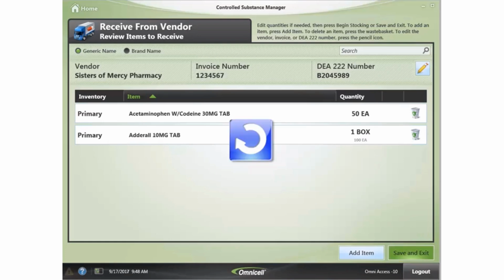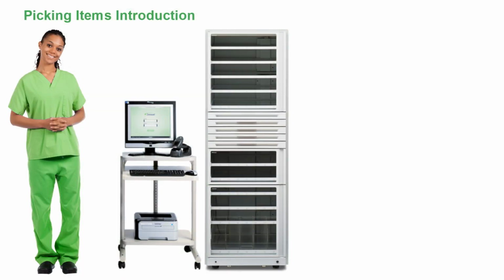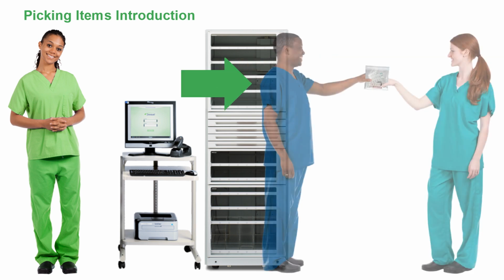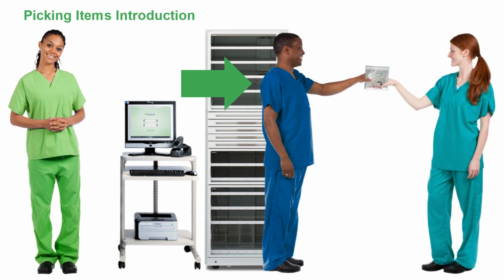If you would like to repeat this demonstration, click the replay button. Throughout your day, you will pick items for various reasons. We will discuss restocking Omnicell cabinets, stockouts, and picking items for patients and for areas.